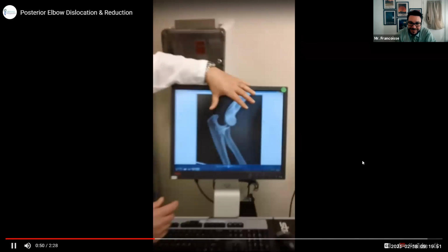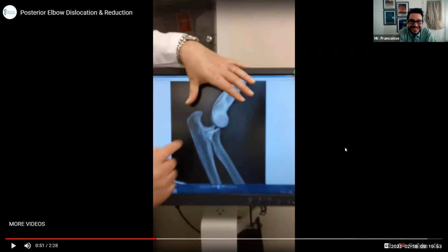Again, demonstrating on the x-ray. All right, what's wrong with this picture? Can you guys see this x-ray, right? Look at this thing. Yeah, this is real. This is a real x-ray. We're going to look at some real x-rays too. We can tell, right? This is not a fracture. Nothing is broken, right? This bone is still intact, but it's in the really wrong place.